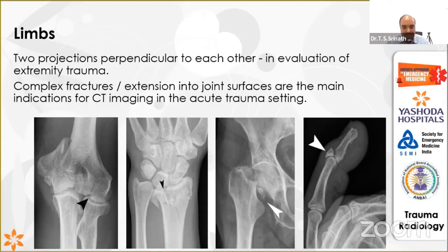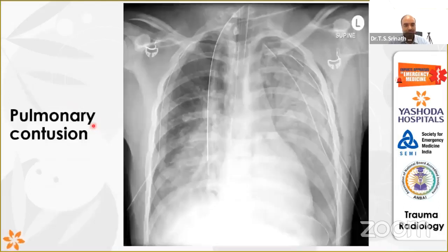There's an arrow mark here. What is this? Anybody would like to take this? Is it normal or abnormal? Nobody wants to answer. Rib fractures, good. So rib fractures are there. Then you have to raise your alarm again that analgesia is important. So multiple rib fractures at multiple locations, what do we call it? There are 2 or 3 rib fractures, and yes, very good. You are all with me. Flail chest. Nice to see the answers.